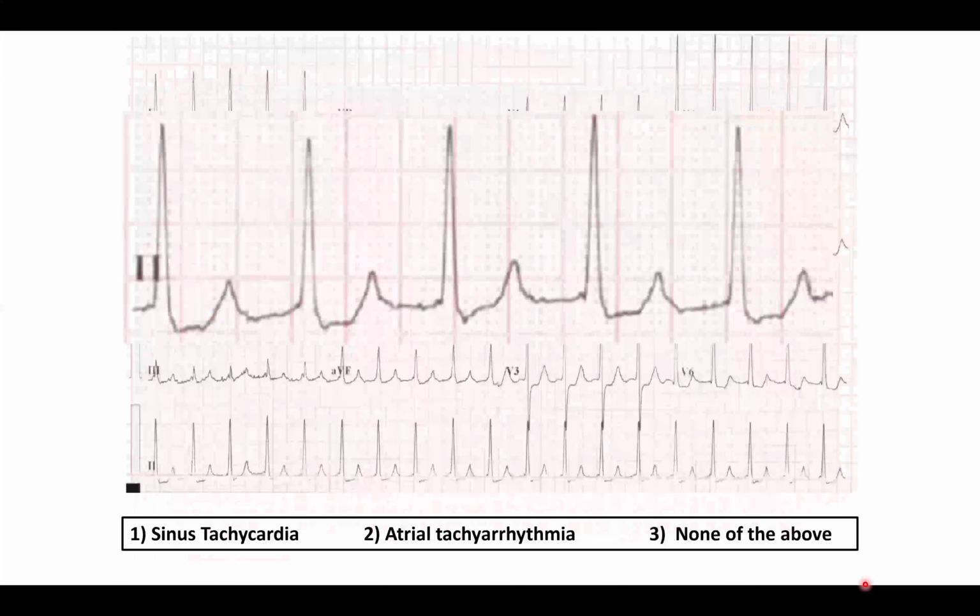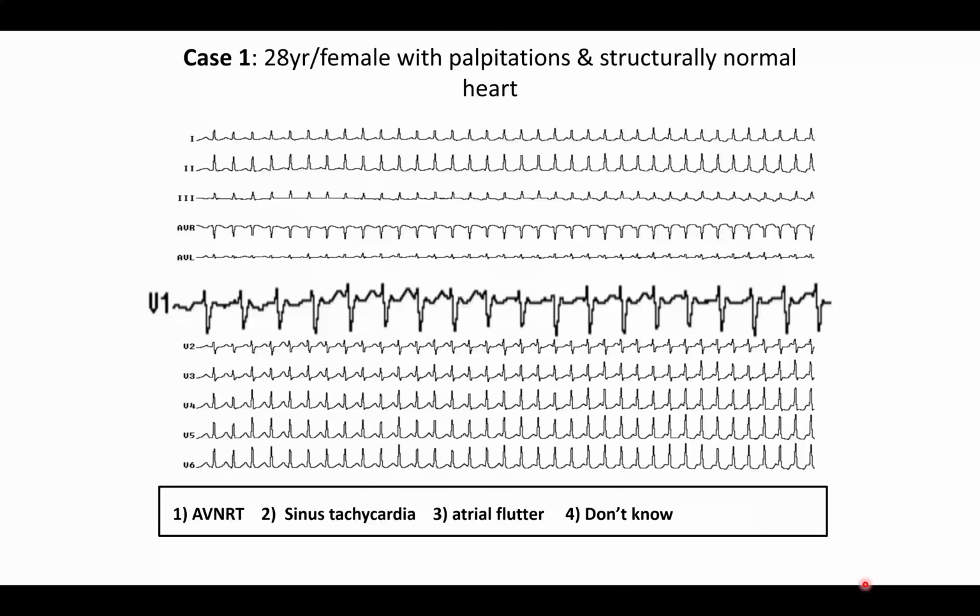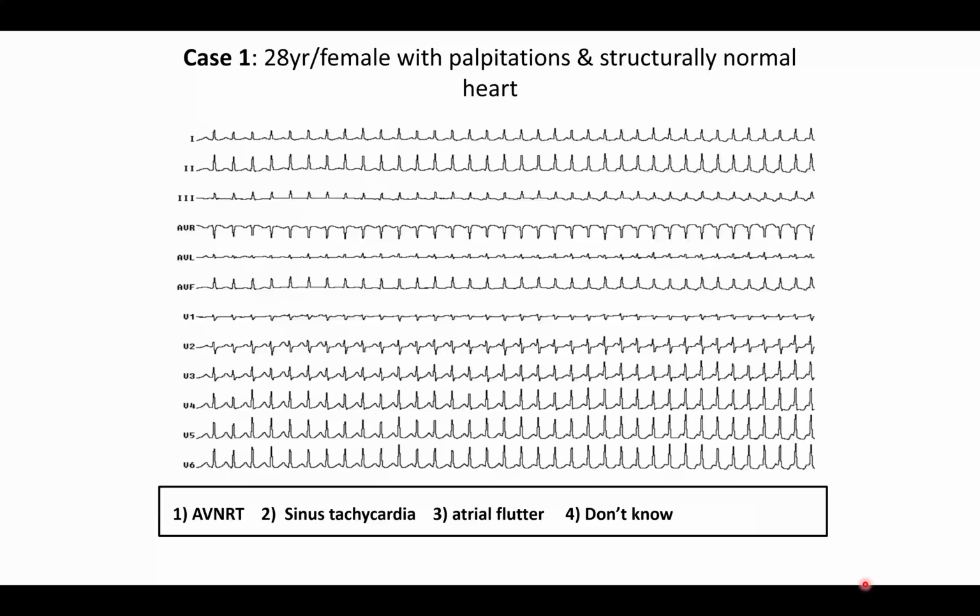Let's focus on the ECG alone. You can see in V2 a little bit of QRS alternans. One QRS is slightly bigger than the other, though maybe not very consistent.